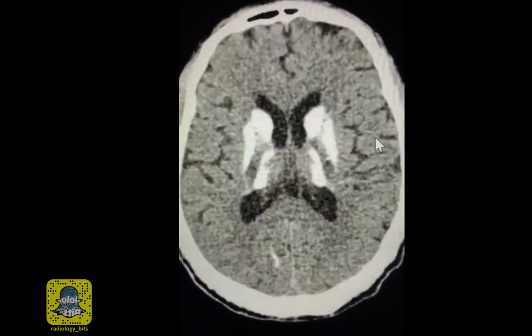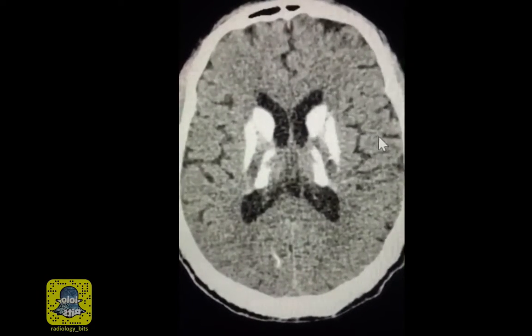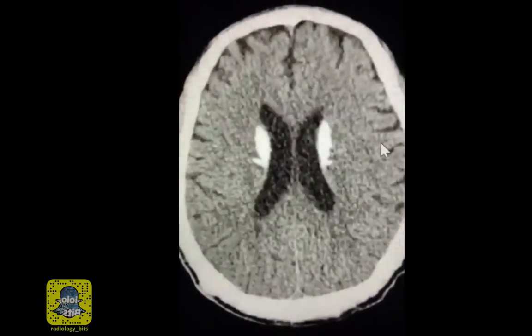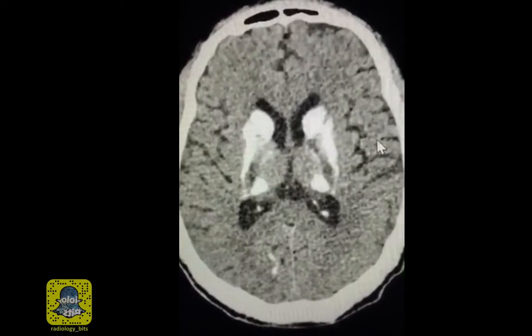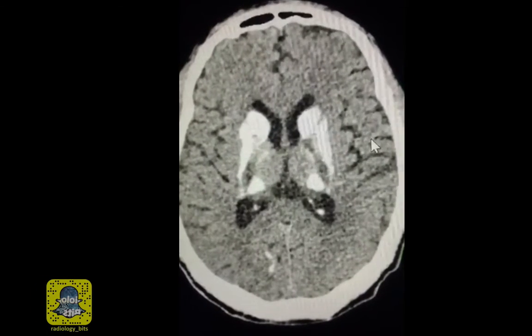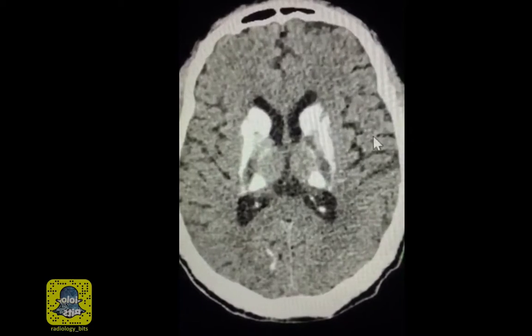For junior residents, remember that you will see calcifications when you do brain imaging, but that's typically not as extensive, not as symmetric, and it should be seen in known locations for normal calcium deposition, typically in patients above 50 years old. As we said, it's not going to be as extensive as you see here. Where do normal calcifications in elderly occur?